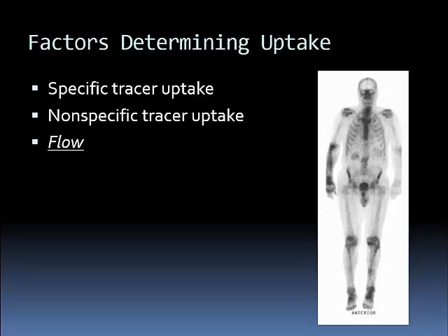This bone scan illustrates the same finding with MDP. So I talked to the technologist and said, I saw the images, did you notice anything funny about the injection? He said, well, I noticed that the vein was pulsating a little bit when I injected it, but otherwise it seemed to be normal. The patient fortunately was still there. I rushed in to take a look.